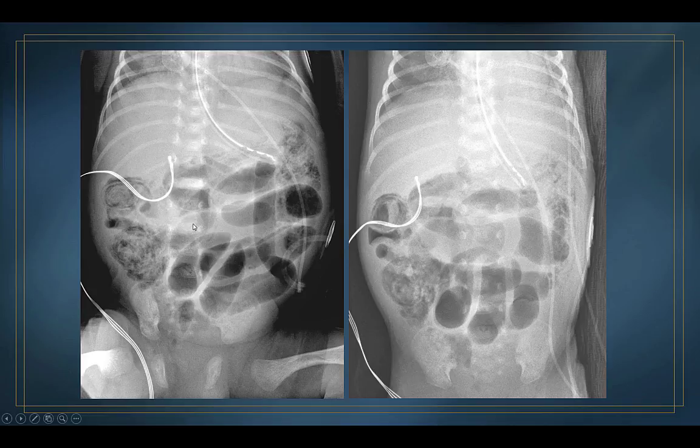Sort of an unusual case, but here's a baby that obviously has cystic and linear, curvilinear pneumatosis in the right flank. Also, the splenic flexure has bowel wall edema. And on the decubitus film, again, you have this peculiar lucency, and bowel loops should never compress adjacent bowel loops. So this is a loculated pneumoperitoneum, and that's exactly what they found at surgery.